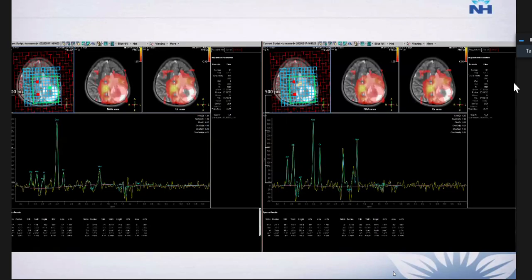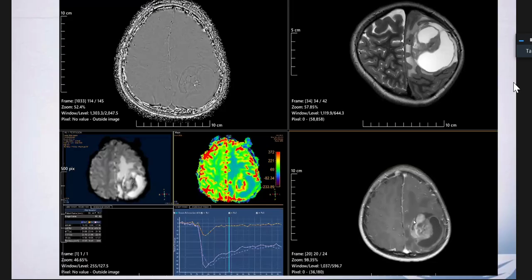So when you see this kind of central wrinkling appearance of the solid tumor surrounded by cystic changes, that is called a peri-wrinkle sign, and this is the peritumoral cyst that we can see here, or peripheral cyst. So these are the signs which are classical for the peri-wrinkle and peritumoral cyst, right?